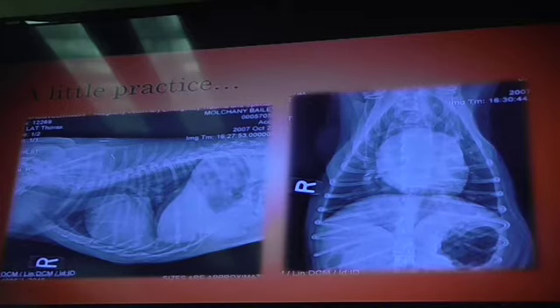No, but we're looking at the carina, so we already had somebody say a little bit dorsally elevated of the carina. That could also be positional. So remember when we're positioning these animals, depending on how we have their heads, kind of upright like they're sitting up, sometimes you have a kink or deviation of the trachea. Sometimes if you have them overextended in the lateral position, you'll have that elevation. So we'll be mindful about that.